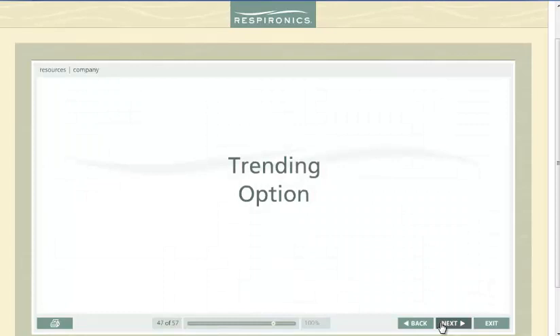The Esprit ventilator has the ability to trend patient data, ventilator settings, respiratory mechanics data, and NICO data for up to 72 hours. Often information viewed over time as a trend is easier to interpret than values on a ventilator flow sheet. Additionally, trending ventilator settings and patient data together present a clear picture of cause and effect. The following examples highlight just a few of the advantages of the trending option on the Esprit ventilator.